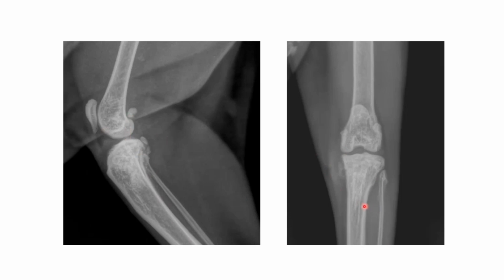So this lesion is classified as aggressive. There are some features here that are compatible with aggressive bone disease: the permeative lysis, the cortical destruction, the irregular periosteal reaction. And we only need one of these features to classify a lesion as aggressive. So we can be reasonably confident that this is an aggressive bone lesion. And biopsy of this lesion was compatible with, or at least highly suspicious of, an osteosarcoma.